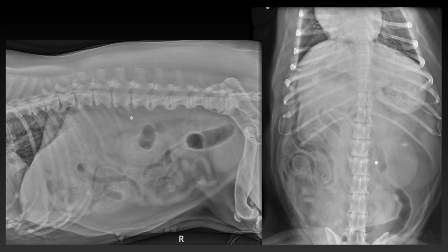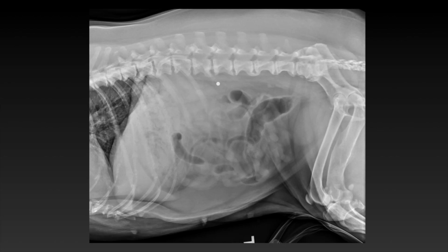The diaphysis of one femur is widened, and the cortex cannot be followed completely. It's really thin or not present here on this level. We do not see any fracture lines, and these areas are bridged by smoothly delineated new bone formation. You can have a look at this femur in the other projection. It looks more or less the same, so there's bridging new bone formation, but the cortex has not reformed until now.